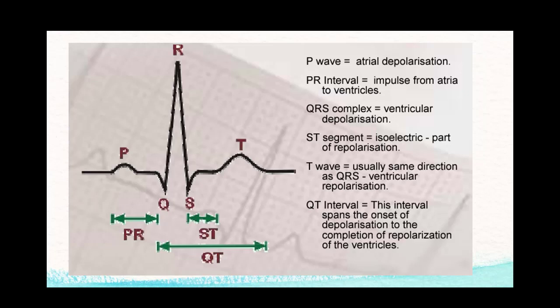In lead 2, your QRS will always be upright, your P wave will always be upright coming from the SA node, and your T wave will always be upright. So if telemetry calls you and says, hey, you have some leads reversed, how they know that is because in lead 2, the QRS is negatively deflected, your P wave is negatively deflected, and your T wave is negatively deflected.